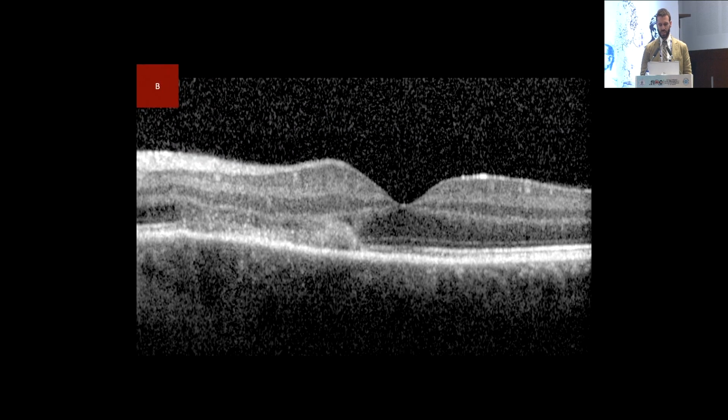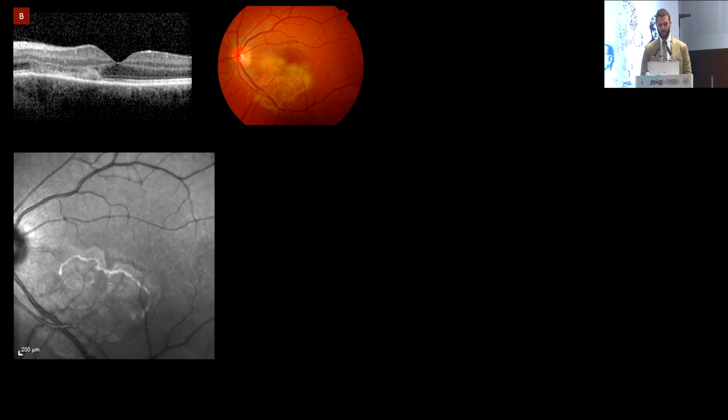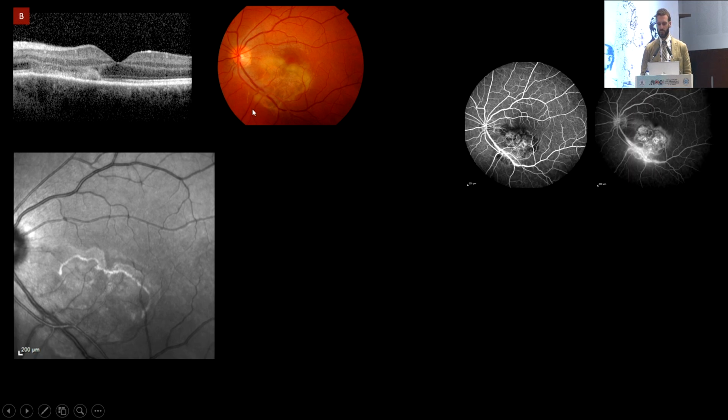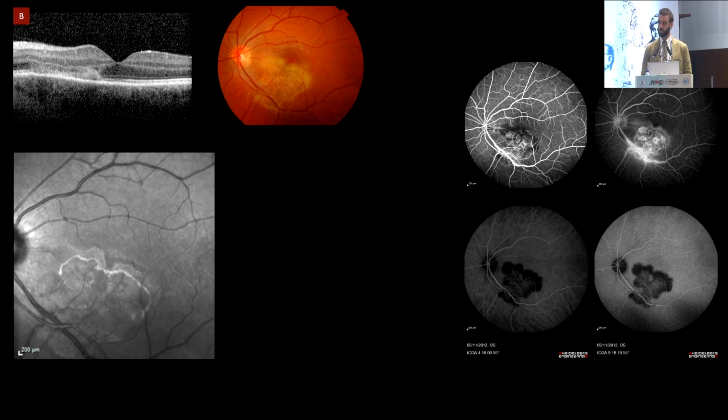Now, moving on to this second patient, same appearance as before. Photoreceptors are fuzzy and hyper. There's hyper of the outer nuclear layer. It's not in the center, maybe it's slightly by the side. So let's examine what the patient has. This is pretty typical. I'm not even going to tell you what it is because it's super easy after seeing all these beautiful pictures, and this beautiful presentation we had before.